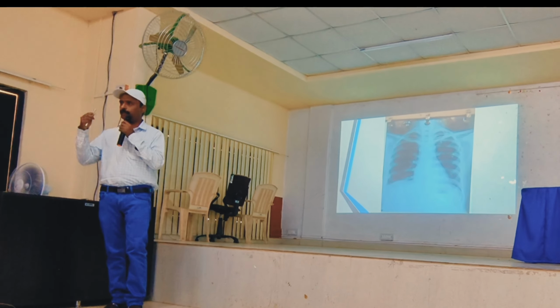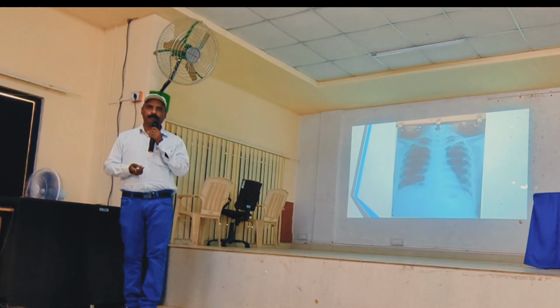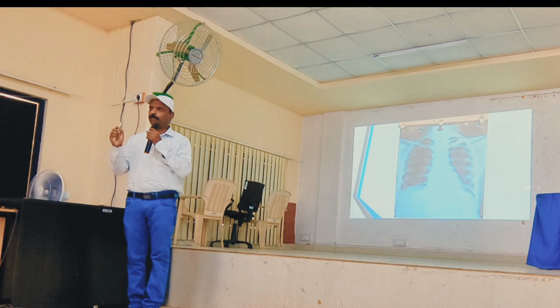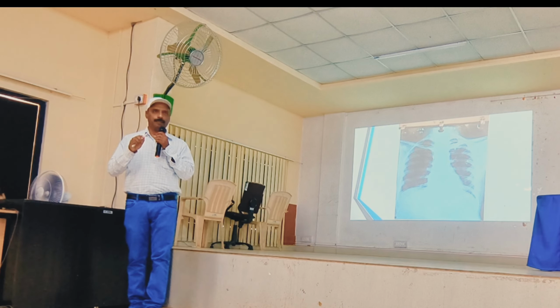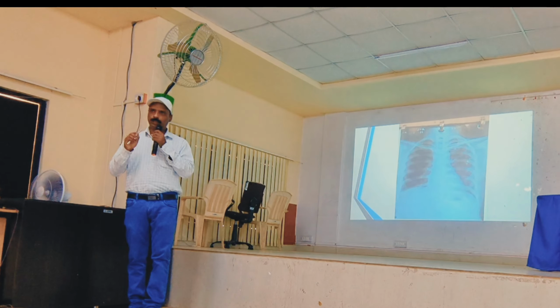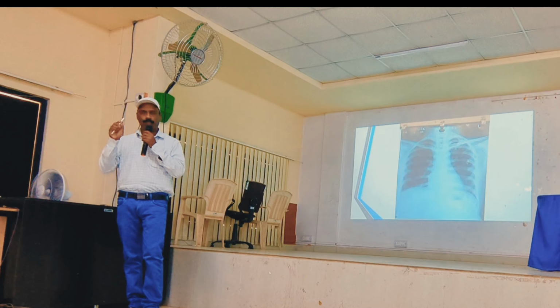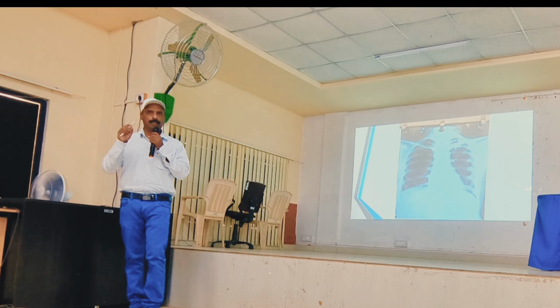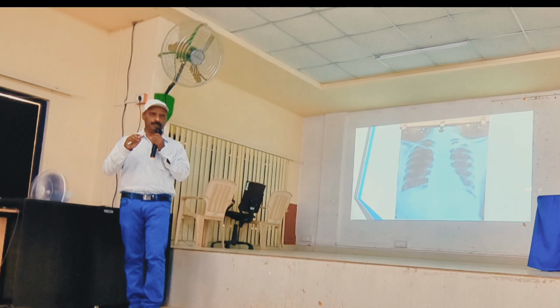So in this kept for the spotting, how you are going to write the points? First you have to tell it is a plain radiograph, or we are going to get the PA chest, which is showing the following normal structures. One is cardiomediastinal and lungs, pulmonary area, cardiomediastinal structures.